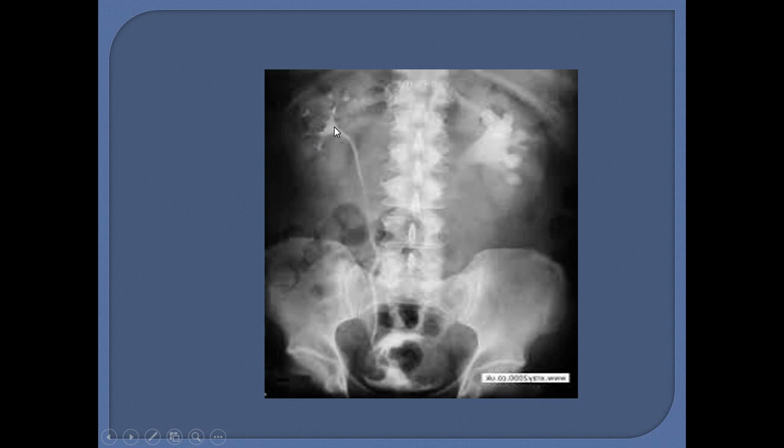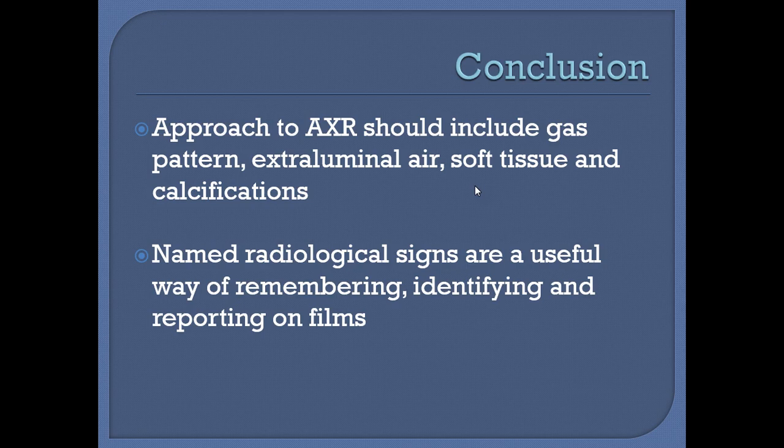Then the renal pelvis, then the ureter, and it goes into the bladder. But on the left side, the system is dilated and there is abrupt narrowing at the pelviureteric junction, and we cannot visualize the ureter, so there is some obstruction in this area with proximal hydronephrosis.